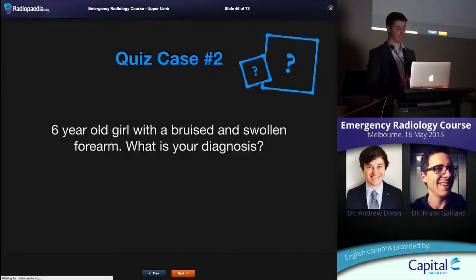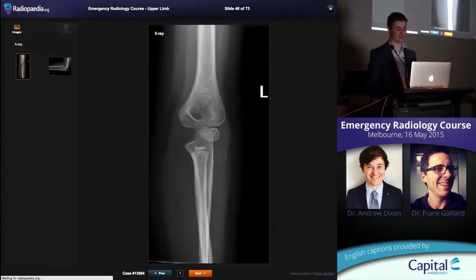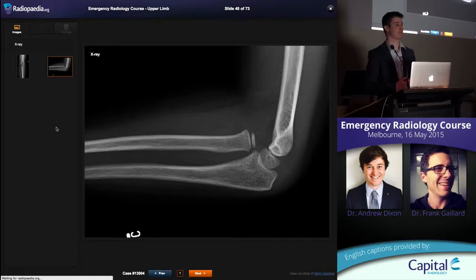All right, next quiz case. 6-year-old with a bruised and swollen forearm. What is your diagnosis? Shahina was our winner. Is Shahina here? Does Shahina want to come down and get a prize or not? You're going to miss out on a prize. Frank, it could be your moment. Frank, it is. Come on, up you come. Tell us about this elbow radiograph. All right, I'll help you out.